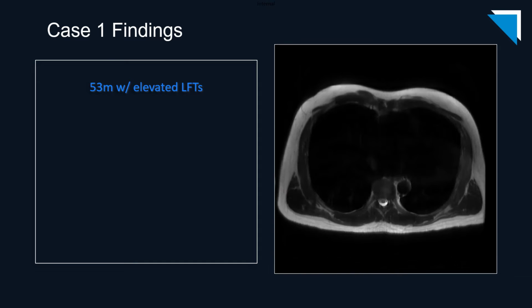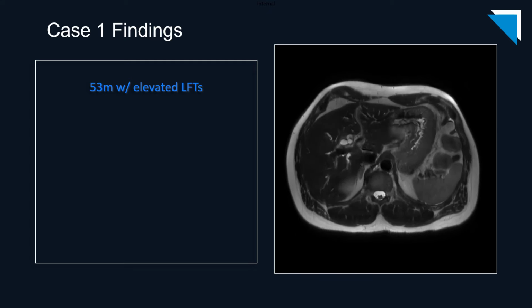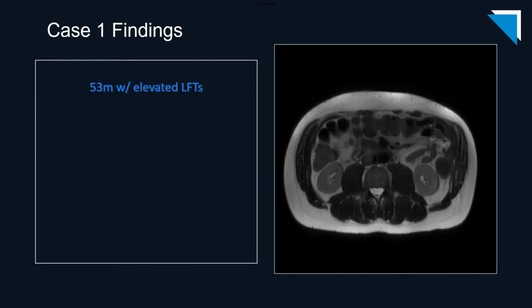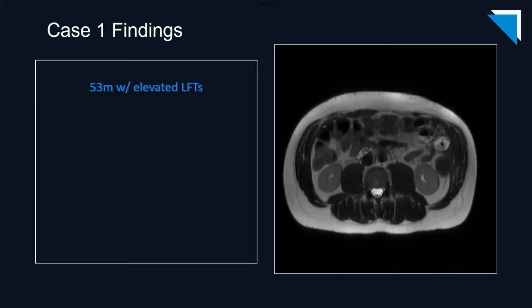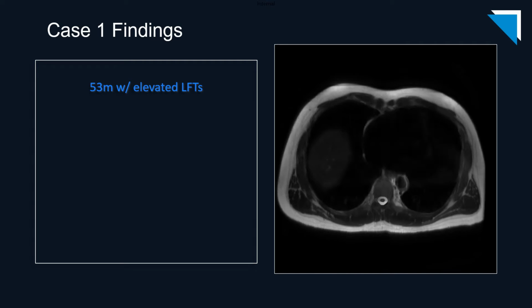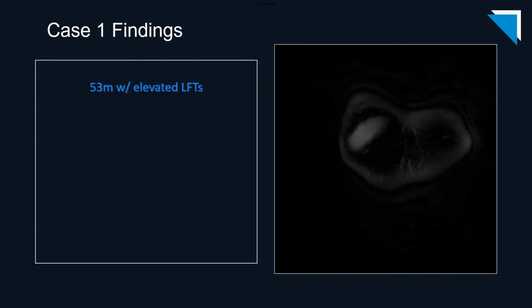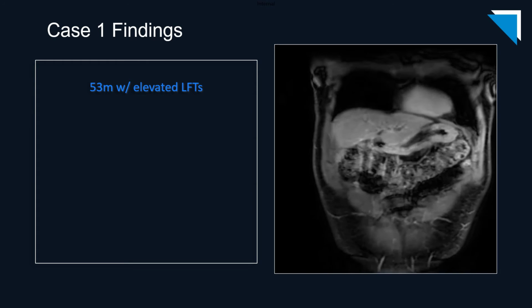The patient subsequently underwent an MRI examination. Here are the axial T2 weighted images from that study. And here is the coronal post-contrast sequence from the same examination.